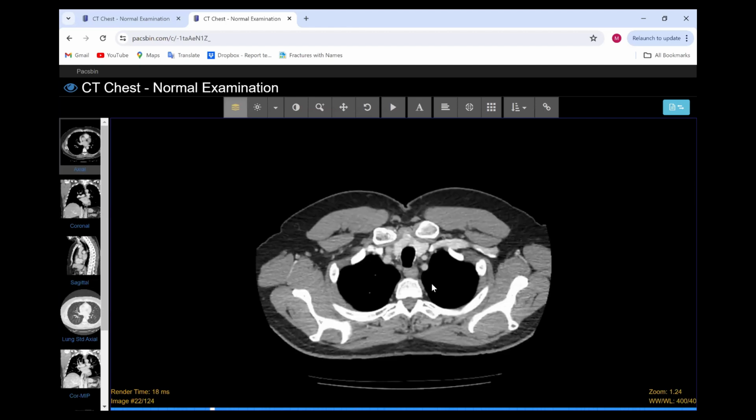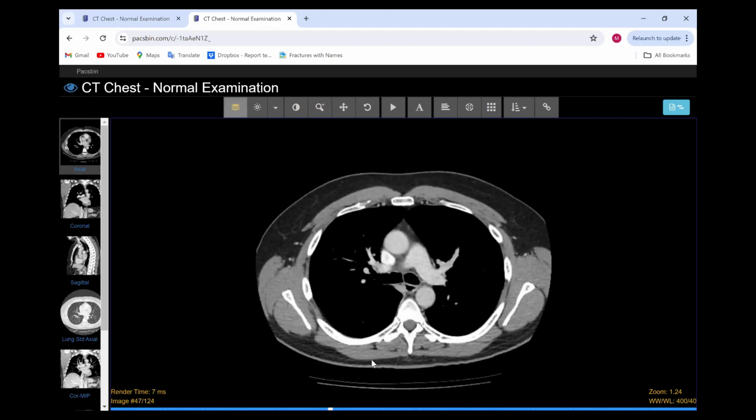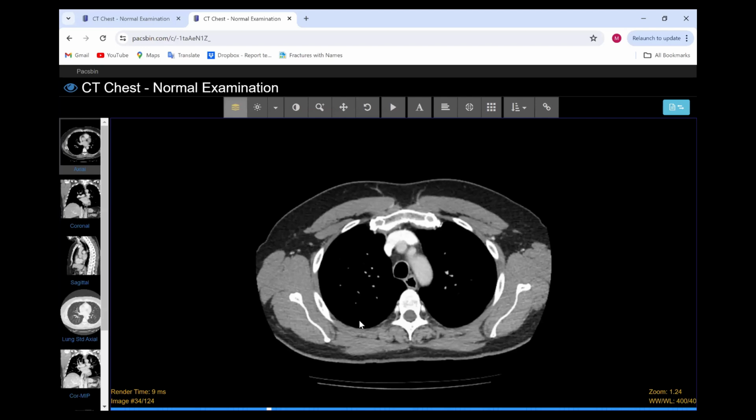That's regarding the chest anatomy. There's no more information regarding it. I already explained everything regarding the muscle in the chest. It is always related to MSK rather than chest. We don't comment on the muscle on the chest wall or in the anterior or posterior aspect of the chest wall.